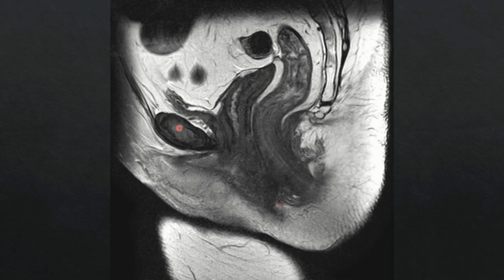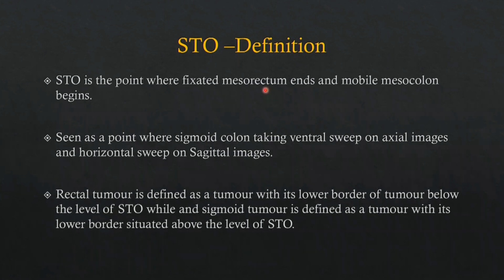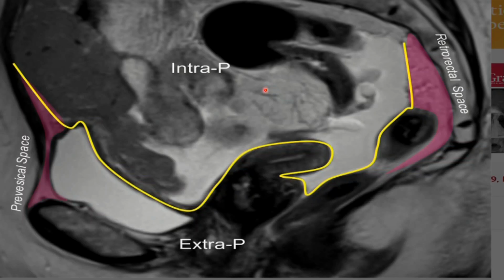Now this we can see the sagittal anatomy; the sagittal section should cover from the extremes to the side pelvic walls. Now this will be the peritoneal reflection. Usually the peritoneal reflection is seen at the level of the seminal vesicles in the male, and in the females at the uterocervical junction. This thin hypointense line, if you can appreciate, is the peritoneal reflection defining the upper rectum, middle rectum and lower rectum. This is the rectovesical pouch; the intraperitoneal space and the extraperitoneal rectum have been shown.